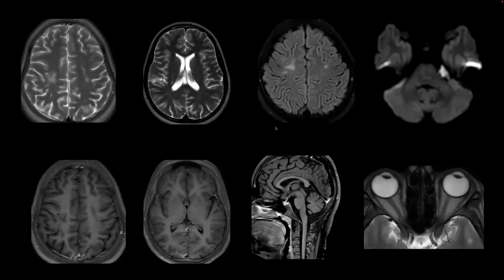One thing that I sometimes find useful in those patients that are a bit atypical, and in the beginning you thought it was a stroke, so there were some atypical features, is that in MS, none of the lesions disappear. In relapsing remitting MS, you only get new lesions. The lesions could get smaller, but they don't disappear. That's the case here as well, exactly.